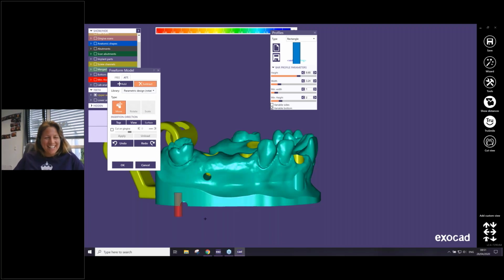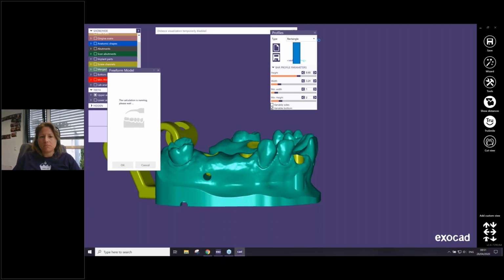And maybe another interesting question, maybe you can show how to work with exoprint here. It makes sense for model printing, I think. Yeah. Okay, then I will click OK. So I don't have so many questions. Okay.